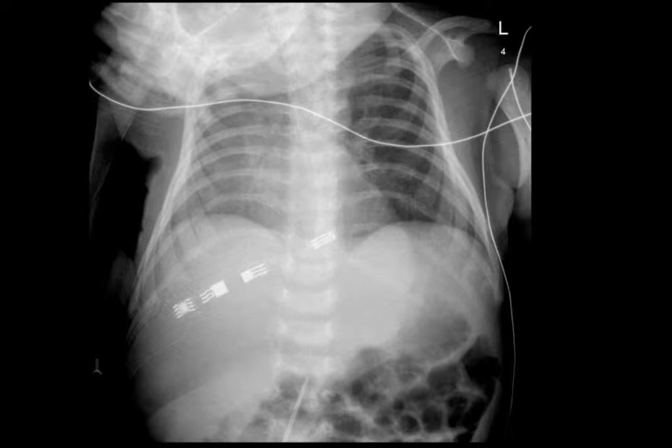Babies that have been intubated for a while, or even if they have never been intubated, often develop problems with mucus plugging. So if you see a focal area of increased density or even increased density in the entire lung, it's almost always going to be a result of atelectasis. There's no reason to raise the possibility of infiltrate or pleural effusion or anything like that.